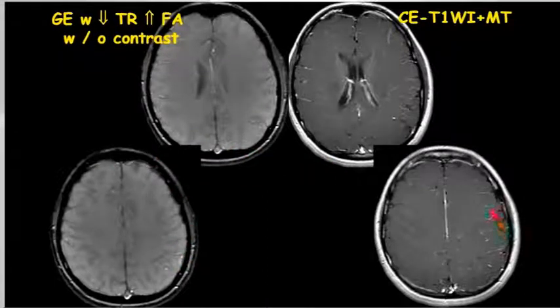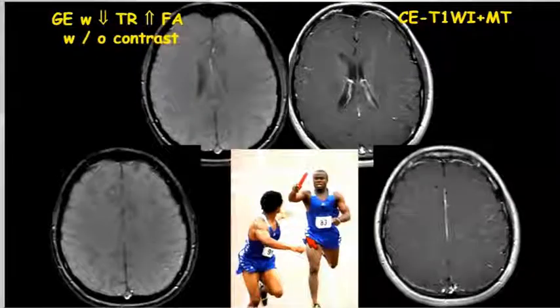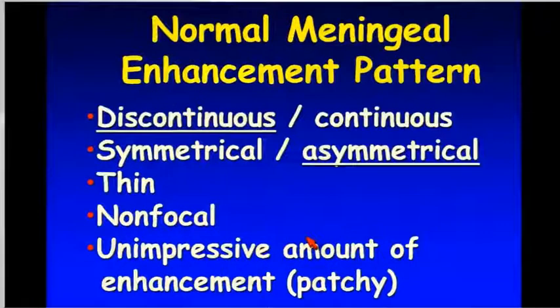a non-contrast. When you give contrast, depending on the echo time and so forth, you can see greater or lesser enhancement. And you have to be a little bit careful, particularly at 3T, if you're using inversion recovery prepped sequences. The white matter can be so bright you may not see enhancement. So the complementary nature of T1 inversion recovery and T2 FLAIR with contrast can be helpful.